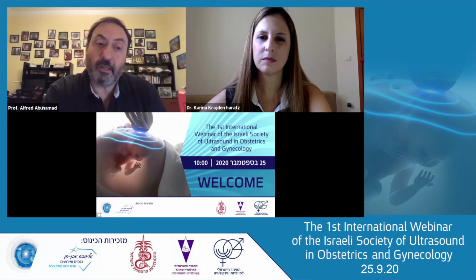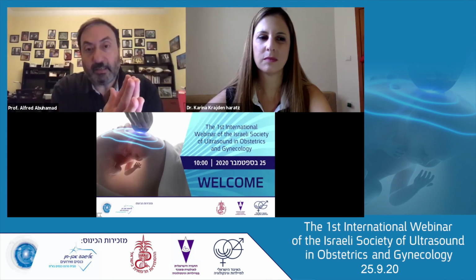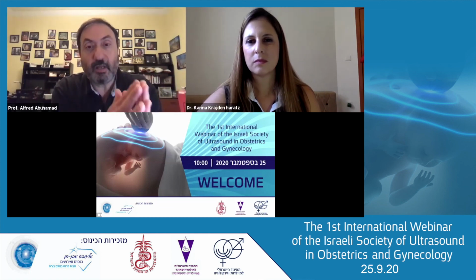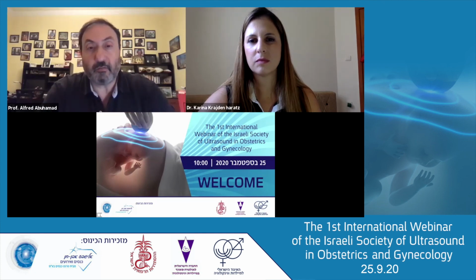What we are looking for, Karina, in the first trimester is really, are the ventricles equal in size? And is there equal flow across the ventricles? Meaning we don't have hypoplastic right or left. We don't have an AVSD. Is the cardiac axis normal? And are the vessels at the 3-vessel trachea view normally oriented? And that's really what we are looking for.